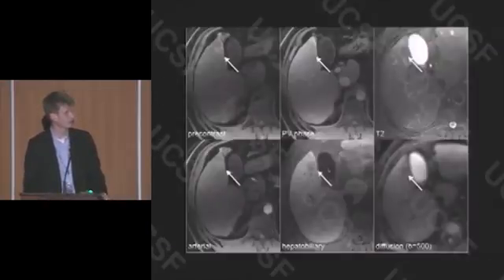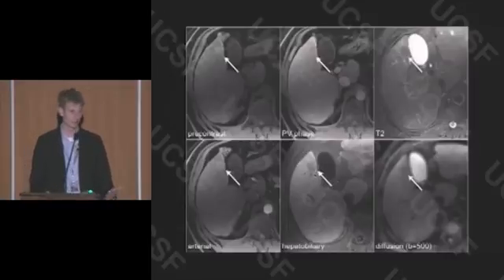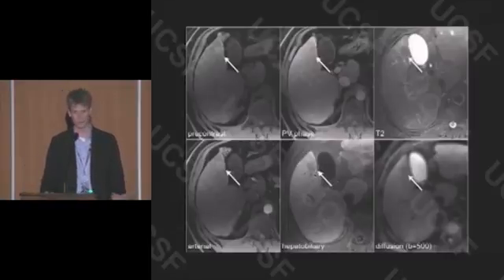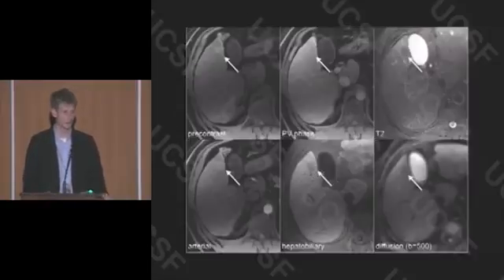Here's another dysplastic nodule. You can see it here, T1 intrinsically hyperintense, T2 dark. It's hypointense in the hepatobiliary phase. You don't see anything particularly on arterial phase enhancement. What do you do with this in the hepatobiliary phase imaging? This would be one that would be at higher risk to become HCC, but it's still a dysplastic nodule. There's nothing indicating that this nodule at this time is HCC. The literature just suggests this has a higher chance of conversion compared to other types of dysplastic nodules when they're hypointense on the hepatobiliary phase.